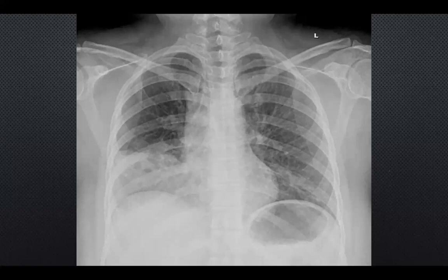That's great. I like that you went back to that system. What I would say about this chest X-ray, or any chest X-ray that you're presenting, is try not to jump straight to the diagnosis. When I said at the beginning, describe the most obvious abnormality and then go through the rest of the chest X-ray, what I mean is describe it. Give yourself time to come up with a differential, but when you're describing it, you don't need to come up with a diagnosis.